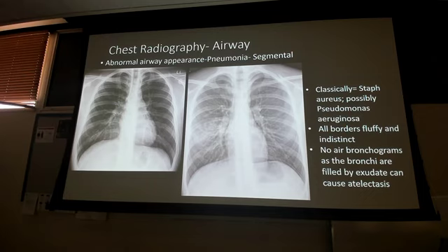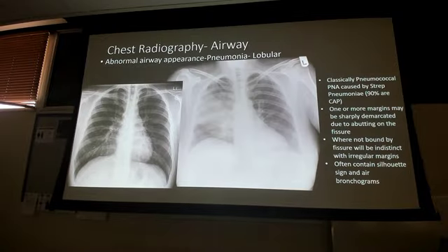Okay. So, segmental versus interstitial, right? We've talked about the segmental, it's in the different segments of the lung. Here's my normal, right? You can see the branching out. What I want you to focus on between the segmental and the lobar, and then I'll get to your interstitial, is the lobular: look how it's just sitting in a lobe. It's in the majority of one lobe.